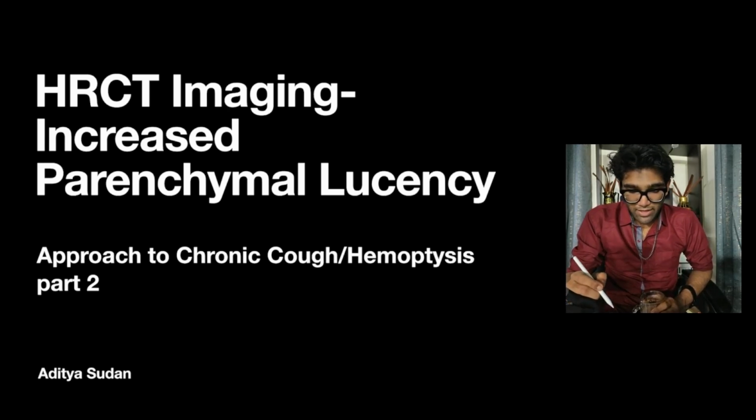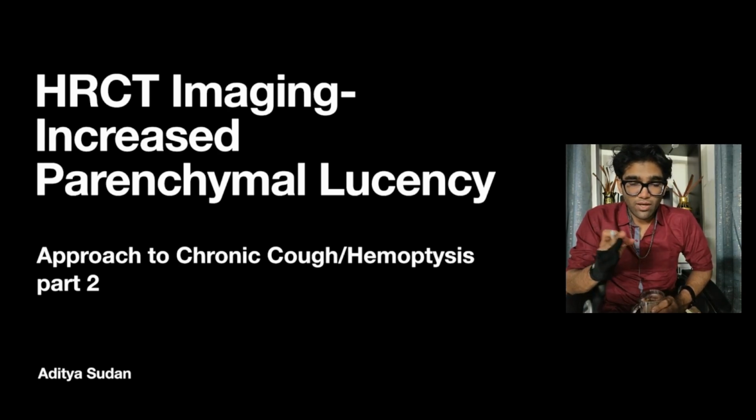Hello, welcome back. So today we'll be discussing HRCT imaging, showing pathologies with increased parenchymal lucency. This will be a second discussion under the approach to chronic cough and hemoptysis. Importantly, this is also a topic that accompanies our general discussion on HRCT imaging, and these two are in continuation with each other.